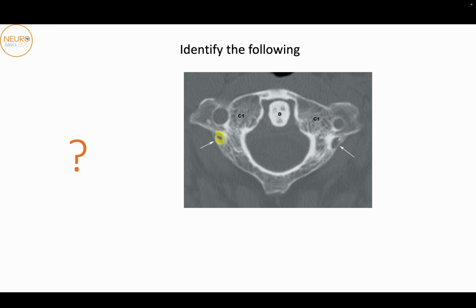Yeah, so this is the arcuate foramen. So as we have discussed, sometimes it is possible that the vertebral artery groove can be covered by a segment of bone, which is known as the ponticulus posticus. So this would be the ponticulus posticus, and the foramen through which the vertebral artery is running is known as the arcuate foramen.